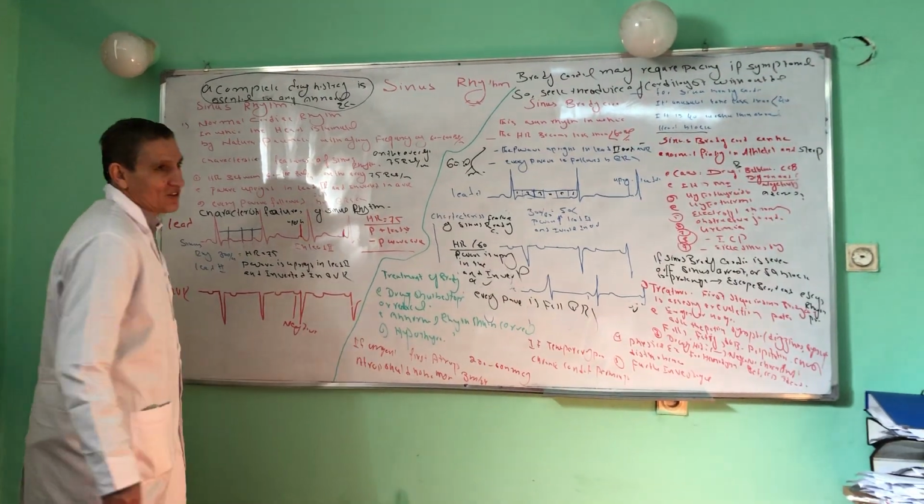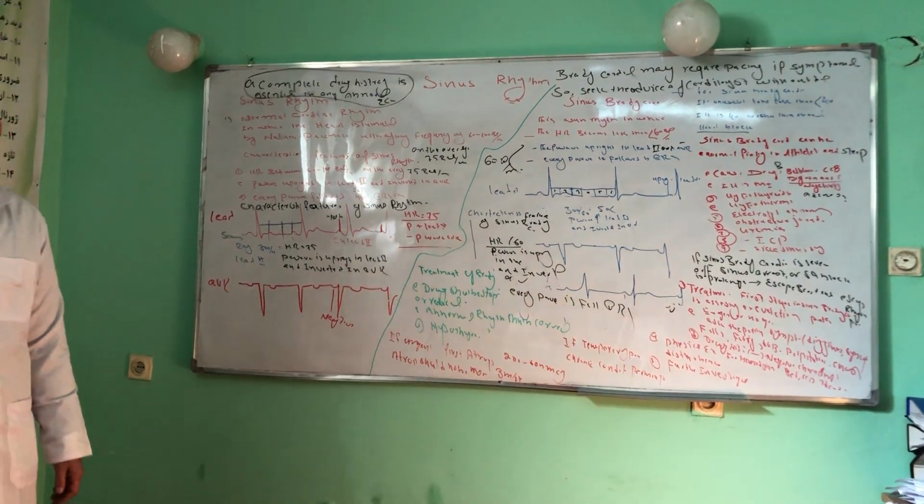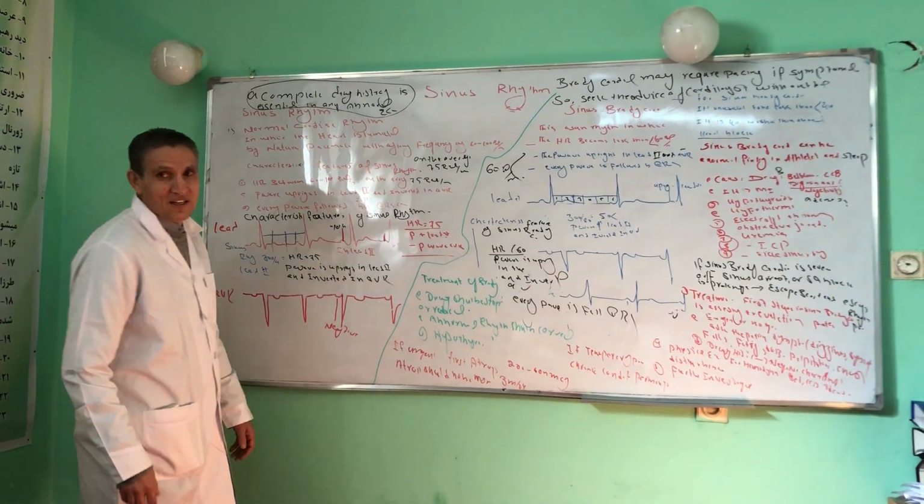In this lecture we will be discussing two things. One of them is normal sinus rhythm, another is sinus bradycardia. First we'll be discussing the sinus rhythm.